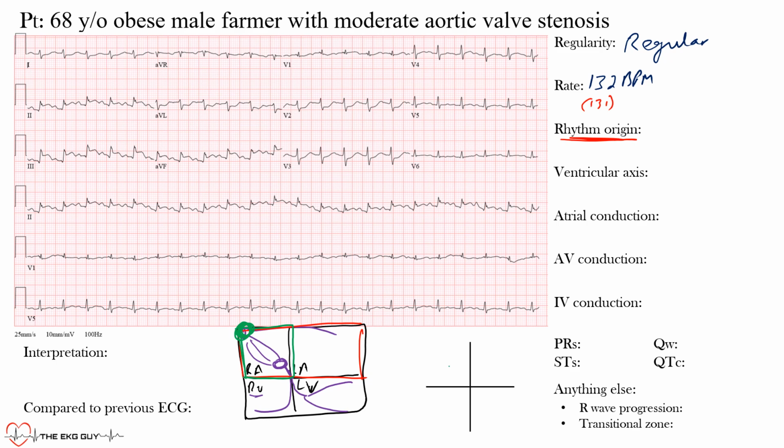And now let's superimpose this on here, okay? So again, we'll put our sinus node up in this area, and notice that the impulse is moving in this direction, okay? Because it's moving in that direction, imagine it going like this, okay? Now again, we're only outlining this area here, and I'm not mentioning this, or this, okay? So that's what I'm focusing on there.